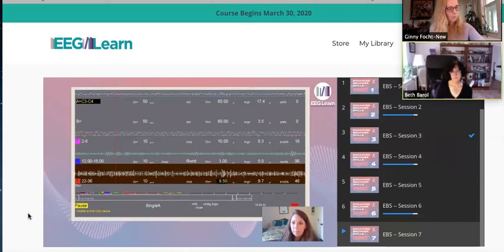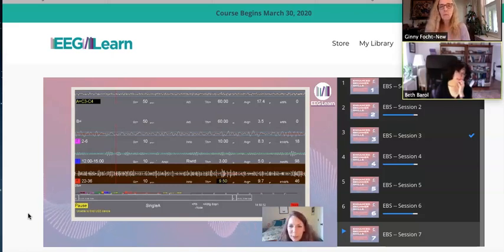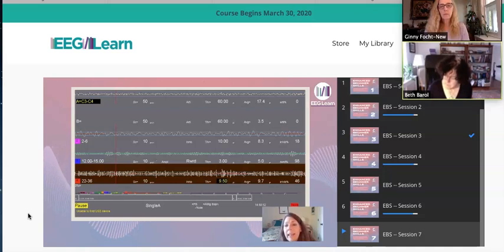So here, I'm always kind of scanning my average amplitudes to see which one's out of whack. The 2 to 6 is good because that difference can be anywhere from 6 to 9 microvolts. This person has a difference of 8.3. The 12 to 15 is good because you need a difference of 5 or 6. They've got 5, so that's good. So then when we look at the 22 to 36, that's our problem.